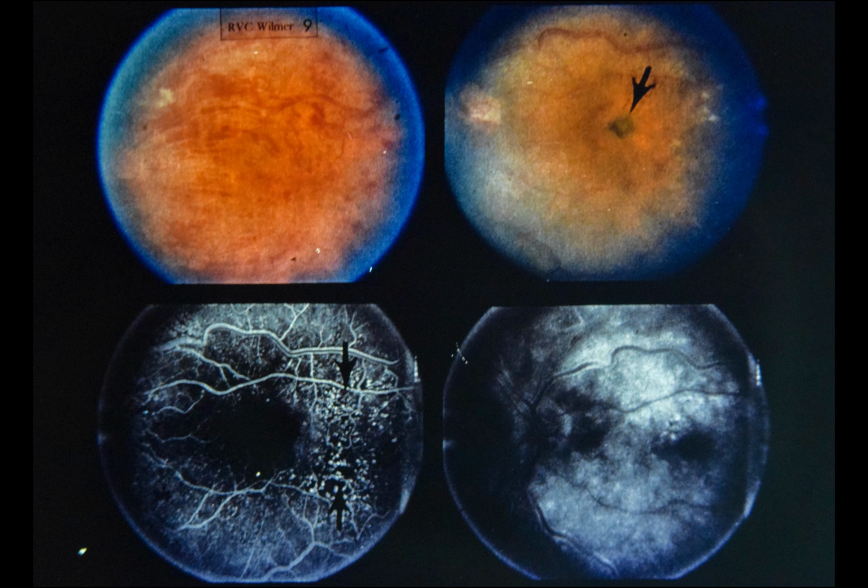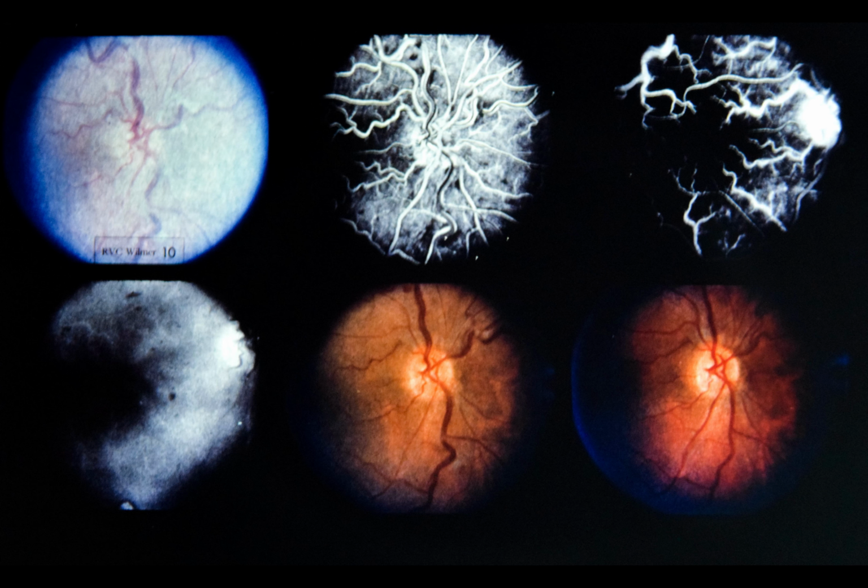Slide 10. Papillophlebitis. Central retinal vein occlusion in younger patients often has a different fundus appearance and a distinctly different clinical course from central retinal vein occlusion in older individuals. This 33-year-old white female complained of blurred vision in the right eye for 1 week. Visual acuity was 20/20. Ocular examination was normal in both eyes except for the right fundus.